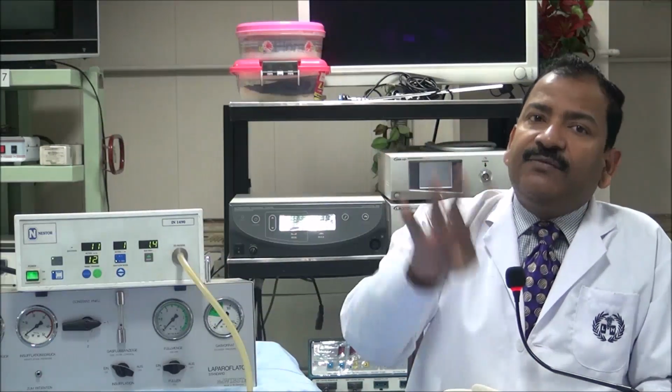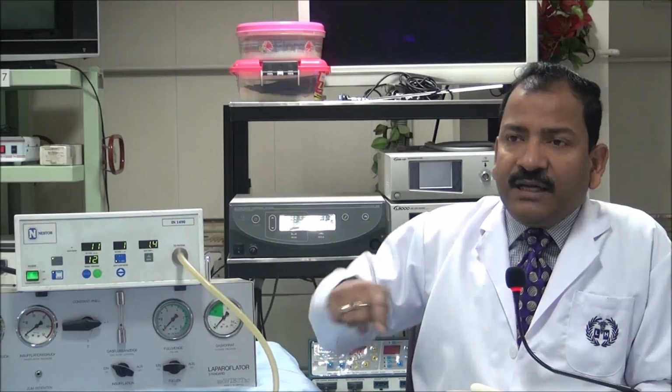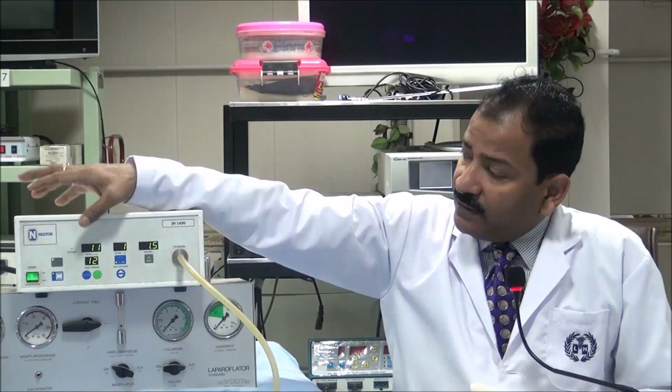So if you are hearing the alarm, like this is my time and my trocar should be in. And if the alarm is there, I will stop and do a second attempt. If in the second attempt also I could not enter the abdomen within 5 seconds, then I should take a third attempt. But alarm means you should stop. In spite of hearing the alarm, if you are pushing, then it is dangerous. There may be injury to the bowel. So this is the microprocessor which is taking care of this.